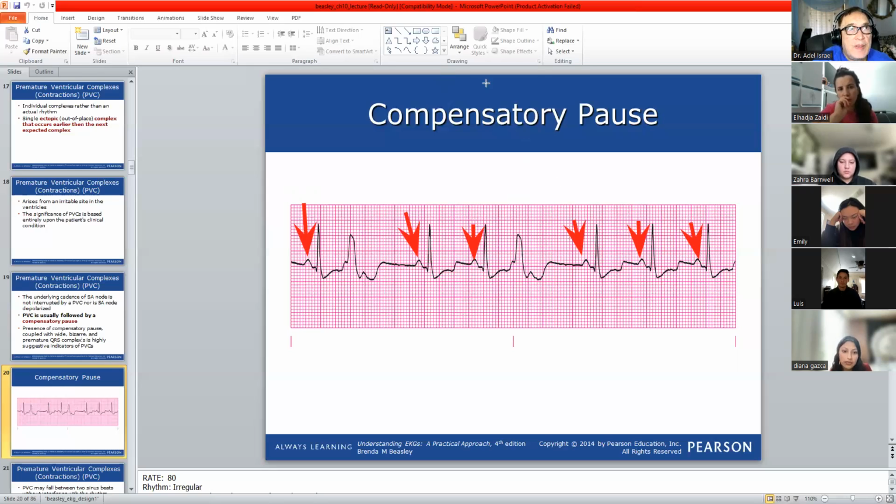Of course, you are very good to count. But what we have here regarding the QRS, can you share with me? Do you notice something with QRS? Two of them wide. Second and the fifth. Very good. So this one? 4, 5, yeah, the fifth one. Right. Very good. So Diana noticed that there are two QRS. They are wide.